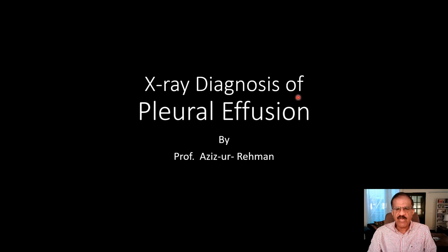And there are actually various radiological appearances. So I will show you the most common one and then the various other abnormalities so that you are able to pick up the abnormality, whatever the pattern it might show. So today's presentation is purely focused on pleural effusion, and we will of course be talking about the radiological appearances. We will not go into the details of etiology and the treatment and other things.